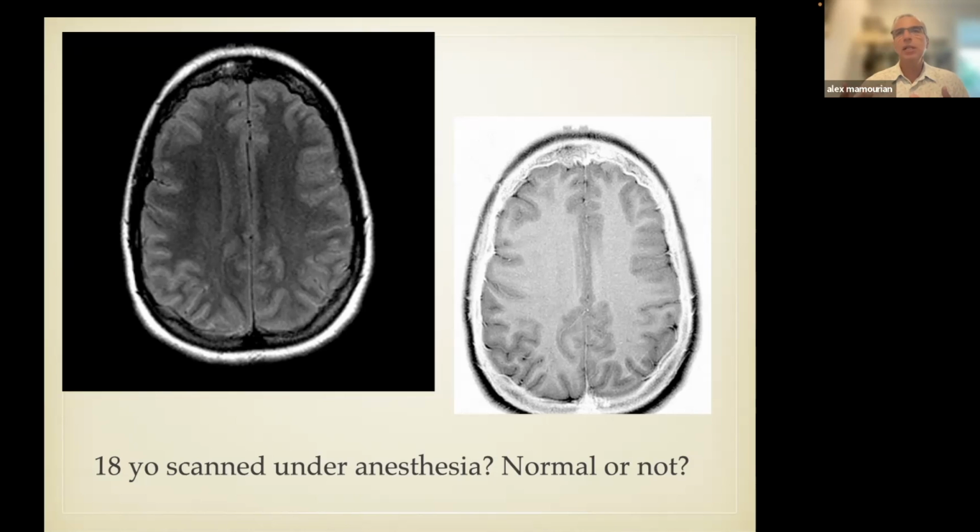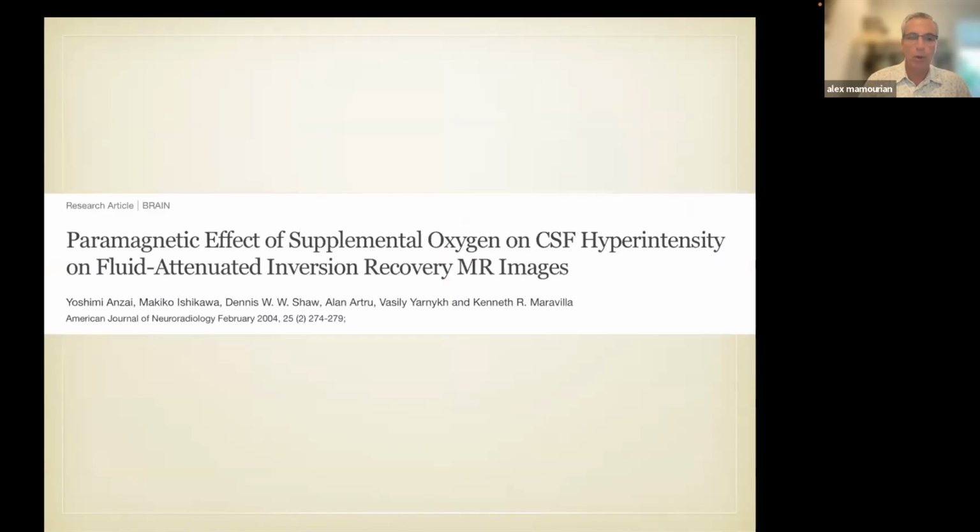This speaks to the sensitivity of FLAIR imaging: just the simple breathing of oxygen, whether from a rebreather mask with 100%, or particularly in patients with anesthesia, where, as you know, they increase the PO2 prior to the induction of anesthesia, particularly in children, the oxygen will alter the relaxation time of the CSF enough that it's visible on the FLAIR.